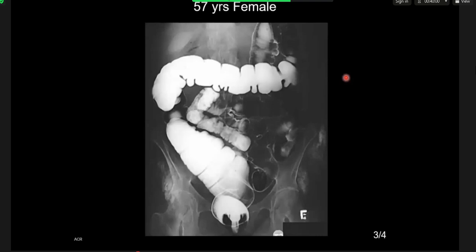So I'm describing this barium film or the previous ones? The previous ones, you remember that there was soft tissue calcification around the digit. And with that, this is your 3rd film. Okay, so this is one of the spot films of a barium enema. In this one, in the background, I can also see further soft tissue calcifications bilaterally in the pelvis region, laterally around the iliac crests. So that further shows more soft tissue calcifications.